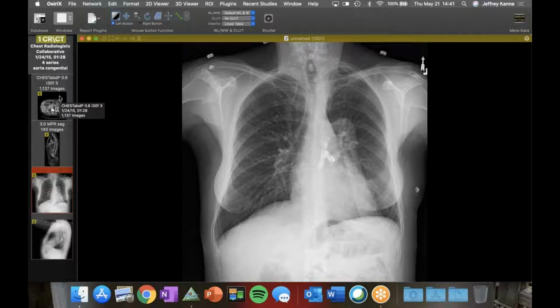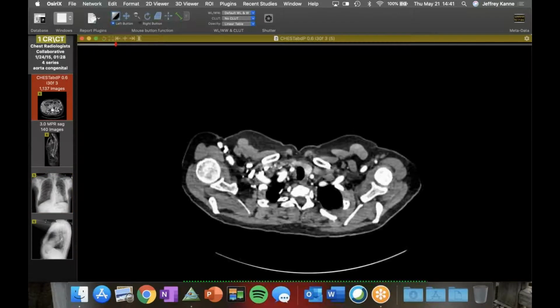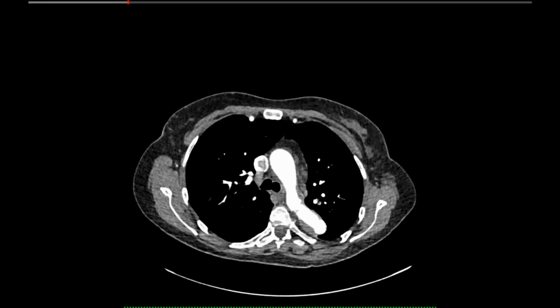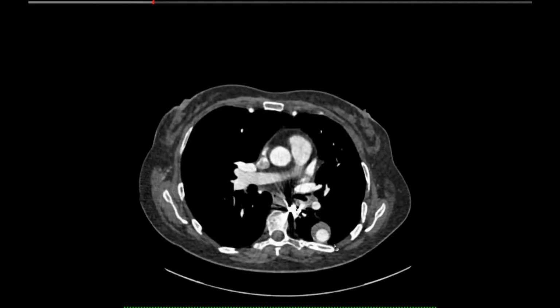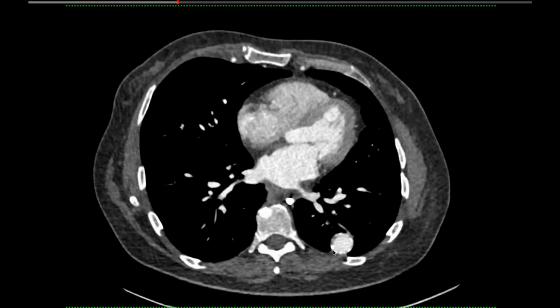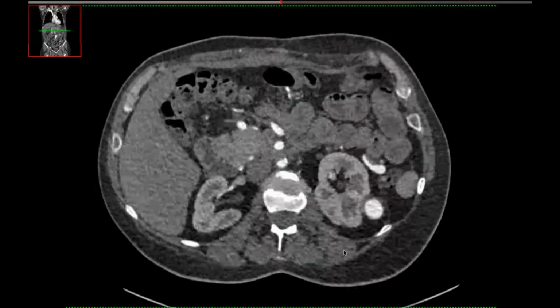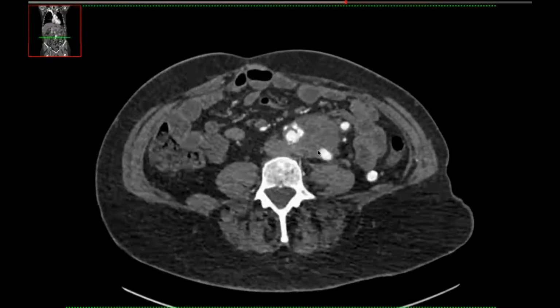It's hard to see. I don't necessarily see a surgical defect over here, but we don't see sternal wires. But this patient has a long-standing history of aortic coarctation, and this is a treatment that's usually reserved for really resistant cases or complicated cases. So this patient has an extra-anatomic graft here. On the CT, we see the conduit coming off the proximal descending aorta, and then it extends presumably in the extrapleural space, although it's interesting how it interfaces like this, but there's fat coming up along it. It extends along the posterior chest wall and then makes its way into the abdomen, where it then will anastomose. And you can see there's an aneurysm at the anastomosis there that's excluded it.